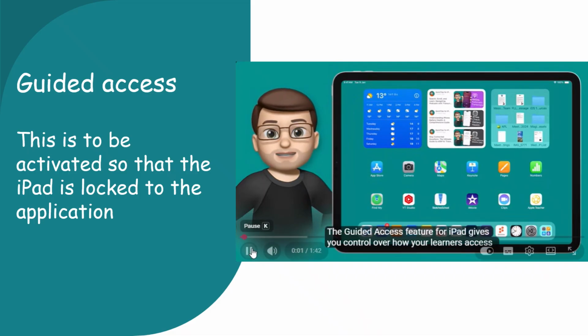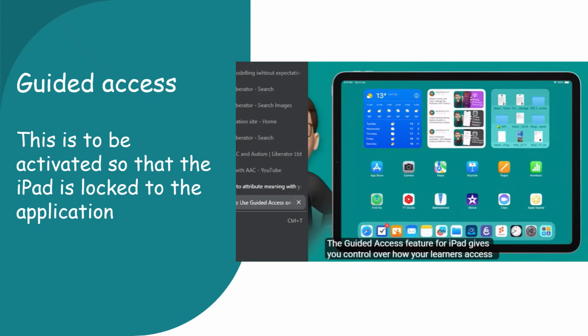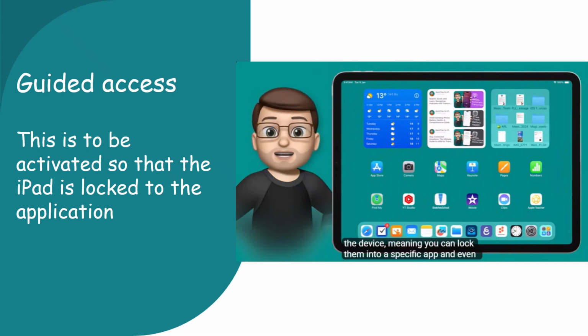The guided access feature for iPad gives you control over how your learners access the device, meaning you can lock them into a certain app and even disable parts of the screen so they can't accidentally leave and go somewhere else.